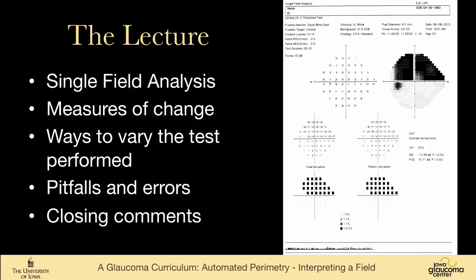So hopefully, next time you see a visual field, you won't be daunted by it. You'll have an idea of how to approach it, and you will not interpret fields that are non-interpretable, and you'll do a good job in interpreting the ones that have good data in them.